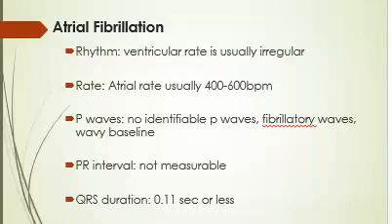So you have no identifiable P waves because the atria is not contracting. It's not squeezing. It is actually shaking. Shaky, shaky, shaky. Basically, there are multiple ectopic foci that are trying to shoot off electrical activity. Unfortunately, this results in a loss of atrial kick and an ineffective atrial contraction. Every now and then, maybe one wants to get through and we're like, oh, there goes an atrial contraction. But for the most part, we just don't have that.